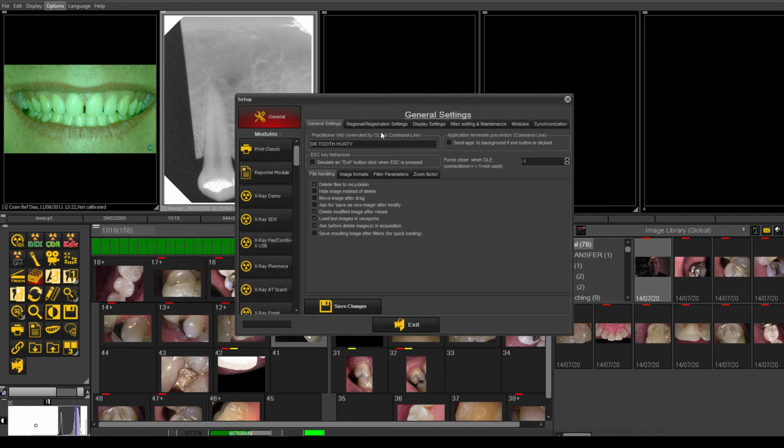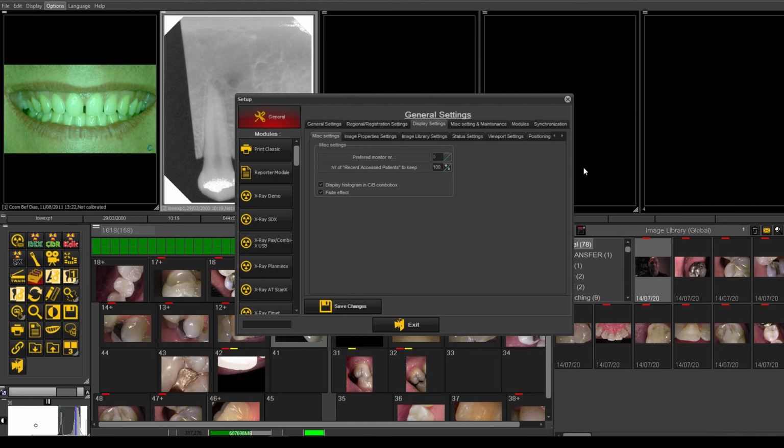And then when you go to display settings and you go to the end where we have the different layouts at the end of sub-desktop custom names, you can name here each one of your desktops based on the layout and what will, I guess, allow you to know what you've created, what you've laid out, and what that desktop layout is. And then you would again save changes.